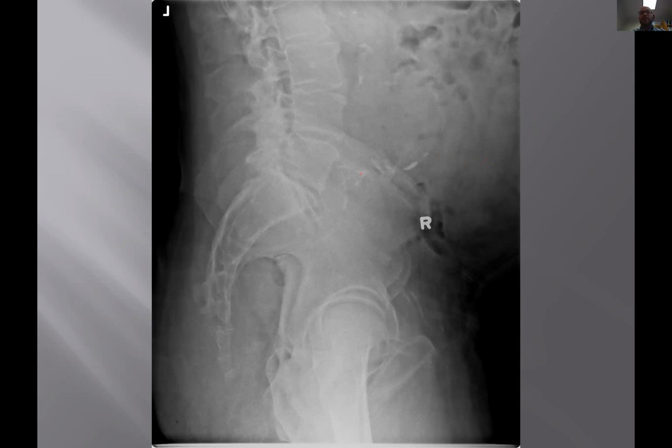Yes, an aneurysm, but give me a differential diagnosis for this appearance. Go ahead and give it a shot. Anybody? Oh, you know, it sure looks like an aneurysm, if you go a soft tissue mass or tumor then. Yeah, good. So a tumor within the abdomen, and what would be unique about the tumor is it has rim calcification. And so the tumor would be more of a cyst type of mass.